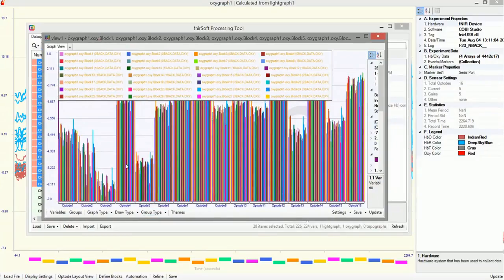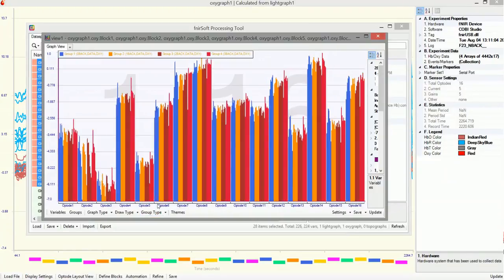Instead of all these labels, the various repeats of the 0-back and 2-back tests, we can auto group them, which means it groups them. The blue one is the 0-back, and the yellow one is the 1-back, 2-back, 3-back, etc. But now you see that this doesn't quite look like we expected, and there's a reason for this.